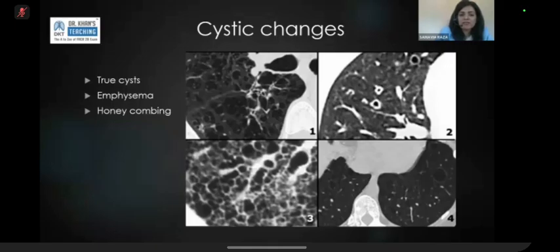The presence of a central strand, a central dot, in a cystic space implies that this is actually what used to be normal lung once. So this is not actually a cyst, it's just end stage disease, or end stage appearance of something. And in most cases, that will be emphysema. And in the context of ILD, that will be honeycombing, but we'll come to that in a bit.